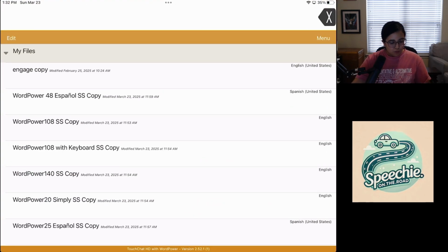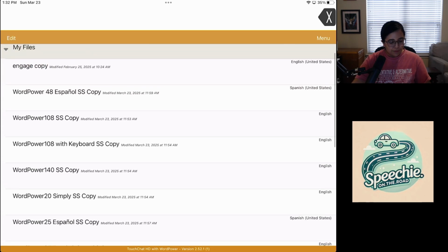When you open it, it opens up into this screen with your files. TouchChat is an app available on iOS from PRC Saltillo. These vocabularies are also available on Saltillo's dedicated device, NovaChat. Whenever I talk about the TouchChat app, I always like to specify which vocabulary I'm talking about. TouchChat is the app, but there are tons of vocabularies. So make sure when you tell someone the AAC user is using TouchChat to also specify the vocabulary set, like she's using TouchChat with Wordpower 42.